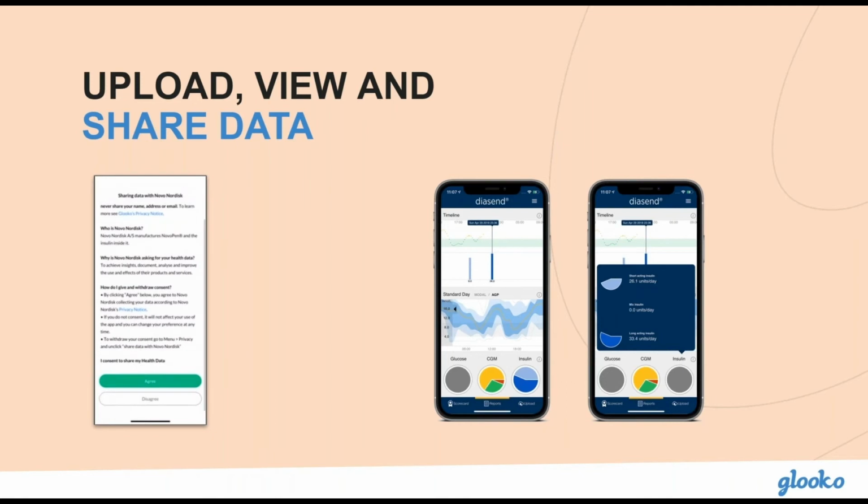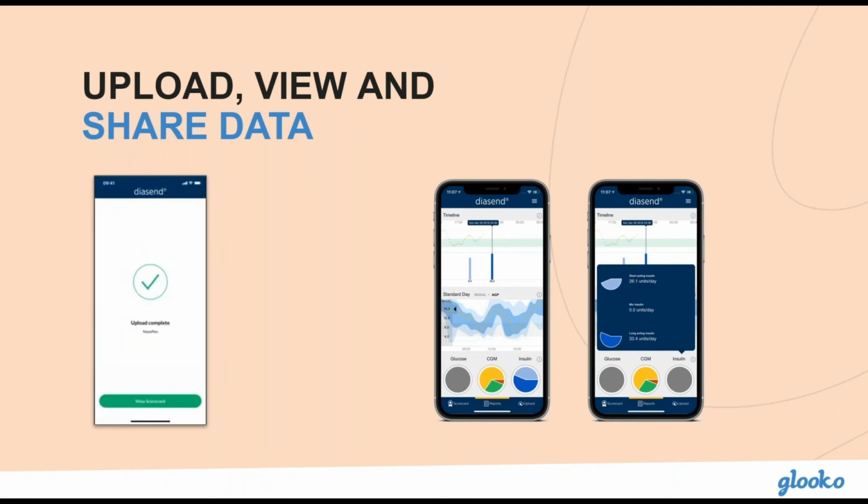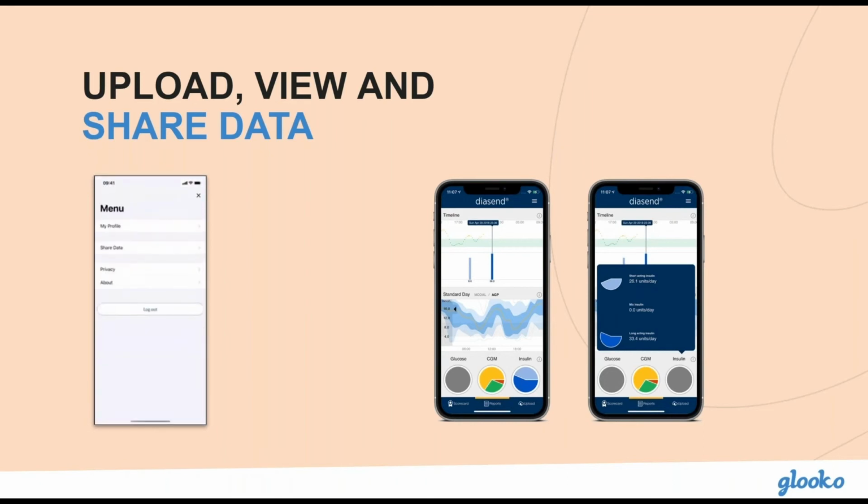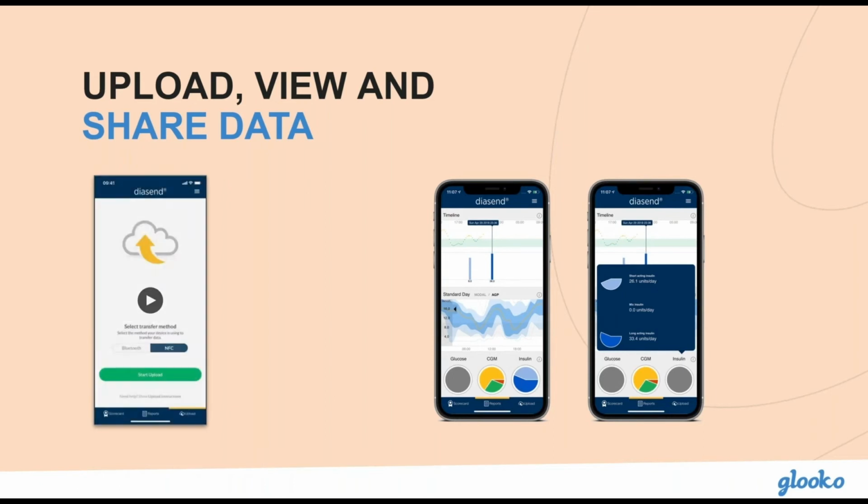Sharing of data is optional. They can either accept or decline, and that will have no impact on the availability of data within the diasend platform. They can also then withdraw their consent to share data at any point by going to the Privacy tab within the menu. Once data is within the platform, you'll see that it is then visualized within the diasend app as seen here. We can see both short-acting and long-acting insulin doses when uploaded from their specific smart pens.